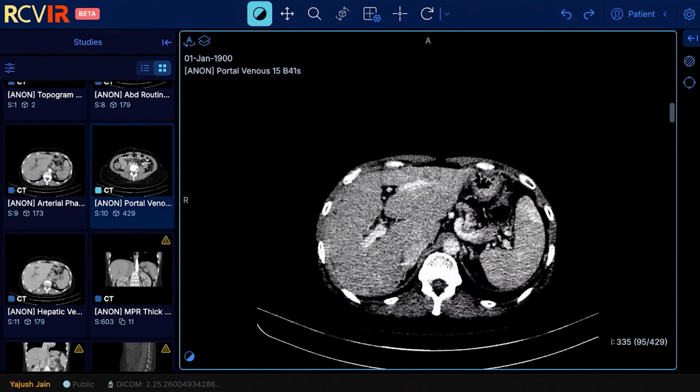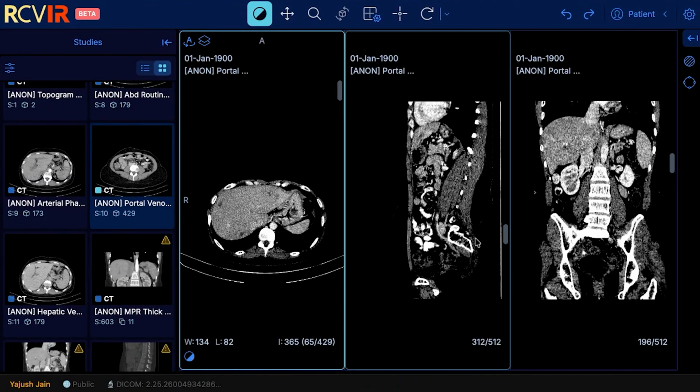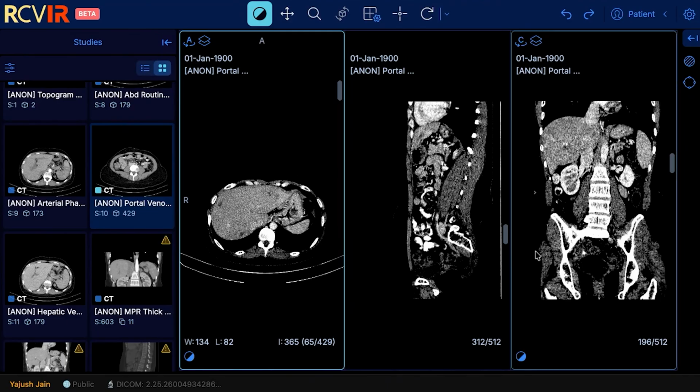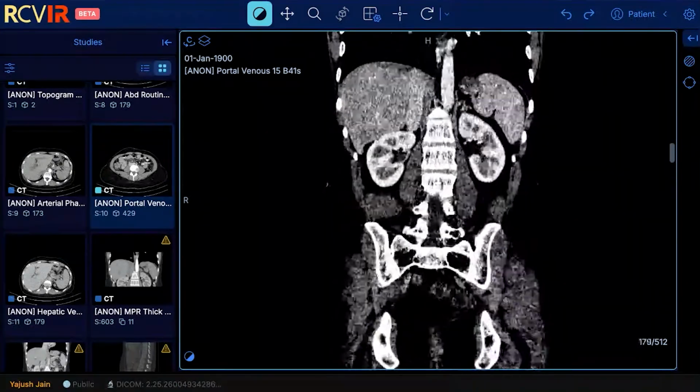Why has this happened? This has happened because the microvascular veno-occlusive disease that we sometimes see in a patient after bone marrow transplant has now converted into a Budd-Chiari syndrome, and we can see a massive thrombus in the hepatic veins as of right now.